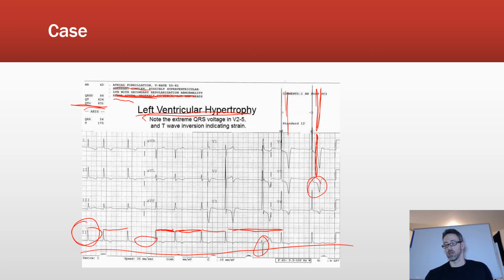Okay. So this is me going step by step through some examples, and obviously if we go back through there, we might find other things, and I welcome you to do that and see what you come up with. I also recommend going online and finding ECGs on websites and practicing them. You can even just Google ECG and use the images and assess it for yourself before trying to find what the answer is, because the reality is you may not find that there is a diagnosis, because we have to put it into context with other things often, but it can give us a good idea, and it gives you a lot of practice.